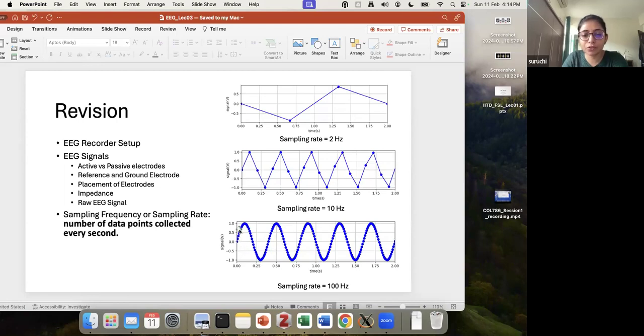The only difference is you took more data here, so you can see the curve nicely. Here you took less data, so it looks more like a mountain. This looks more like what we call a sinusoid, or more like a wave pattern. So these two things have to be very, very clear. Otherwise, we can't proceed with anything else.